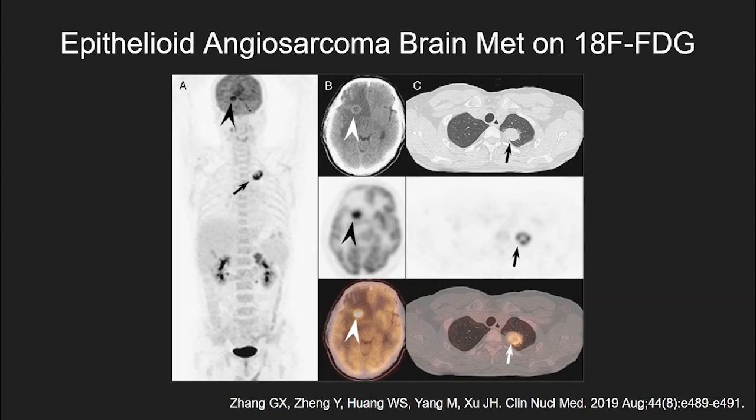Many metastatic tumors, which represent the highest percentage of brain tumors, demonstrate intense FDG uptake above background.